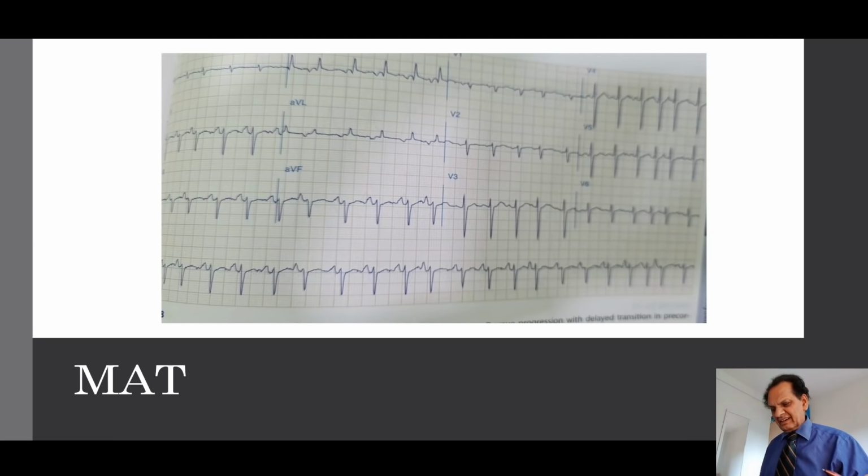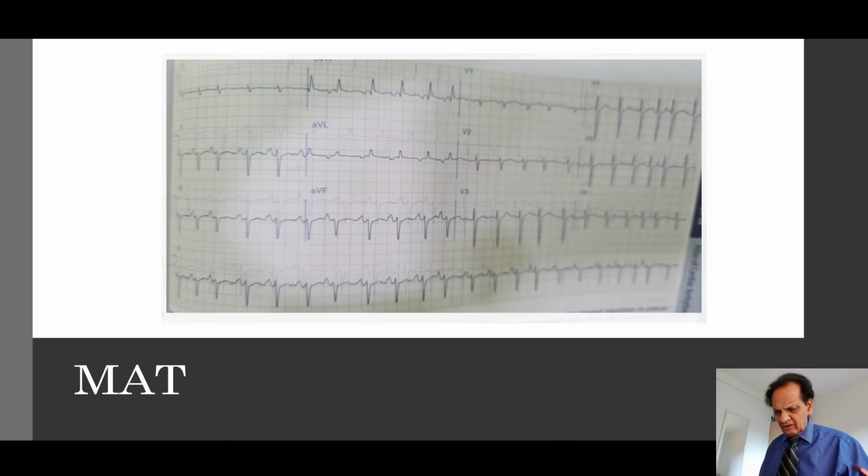Multifocal atrial tachycardia. In a case of COPD acute exacerbation, you can see the different P waves here of at least 3 morphologies. Very nice picture that way, and you can see in the V1 all the different types of P. So 3-4 different types of P and a tachycardia is very suggestive of multifocal atrial tachycardia, may lead to atrial fibrillation also later on.